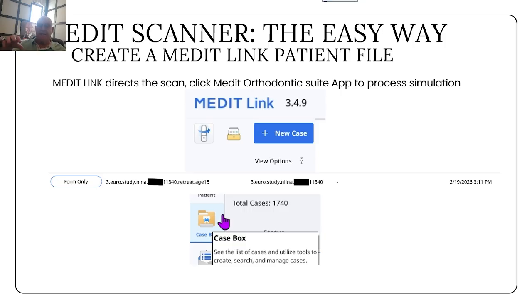That has to be synchronized back and forth between Medit and the cloud, and it's done automatically. You don't have to think anything about it. So Medit directs the scan, if you have a Medit scanner. If you don't have a Medit scanner, of course, you have different software to run your scanner.